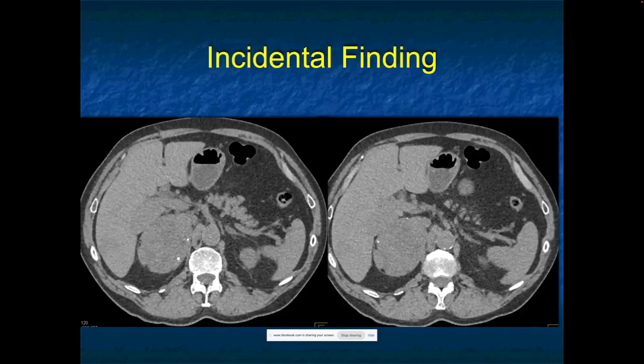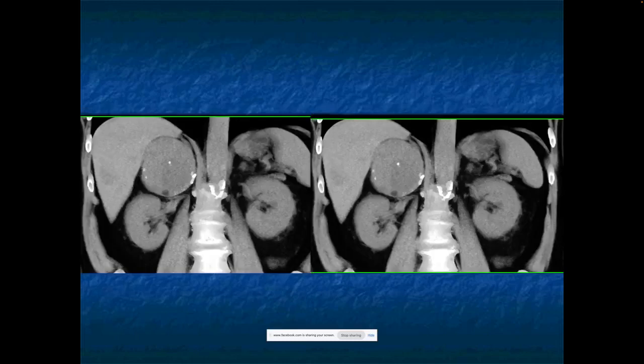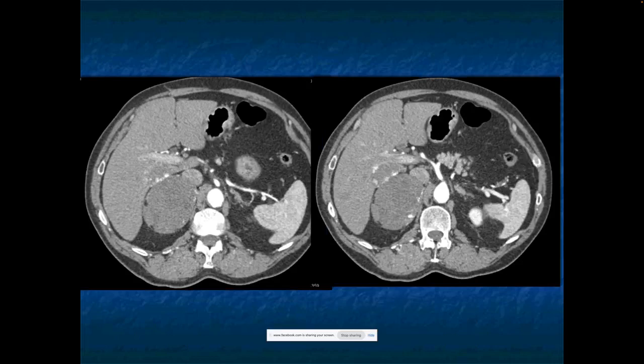Another patient, adrenal mass, calcifications and some fat. I looked at this and say calcifications and fat, it's a myelolipoma. When you look at the lesion, when it enhances, it's not very vascular. A little bit of peripheral enhancement. The kidneys function normally. There's a hemangioma in the liver.